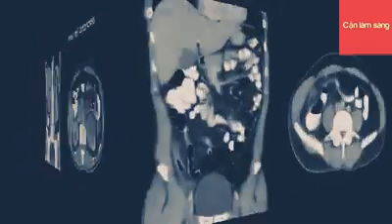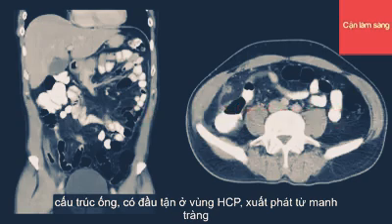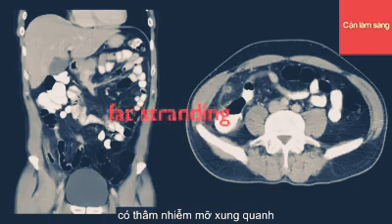So there you have it, some CT features of acute appendicitis: blind-ending tubular structure in the right iliac fossa arising from the base of the cecum, with thickening greater than 6 millimeters and surrounding inflammatory fat change.